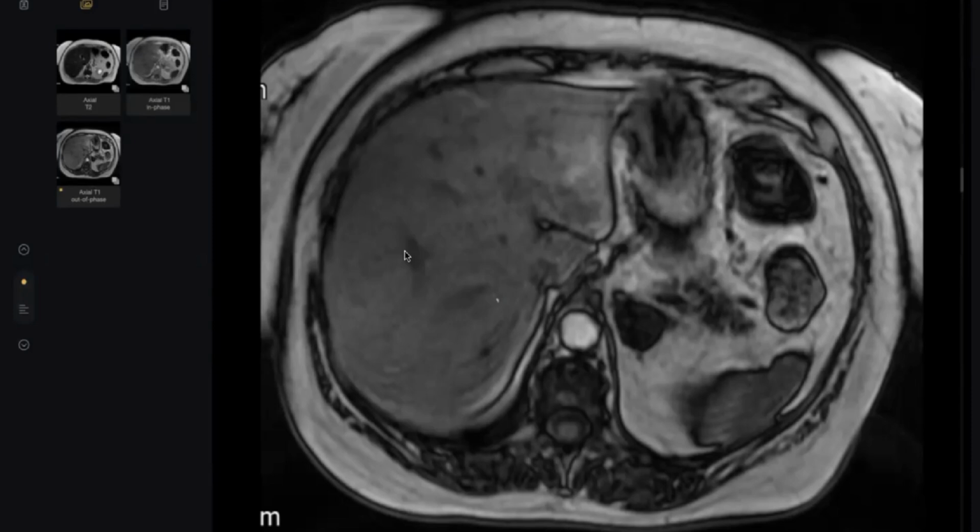Okay, from 1 to 5? I think between 4 or 5. I don't accurately remember the number, but any mass above 4 or 5 you should suspect malignancy. Any mass less than 10 HU, Hounsfield unit, is in favor of benign. If it contains any fat component, it is benign.